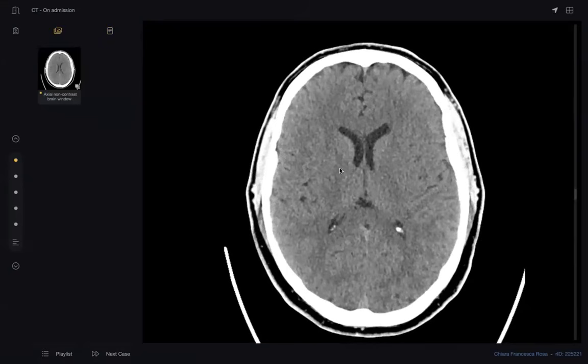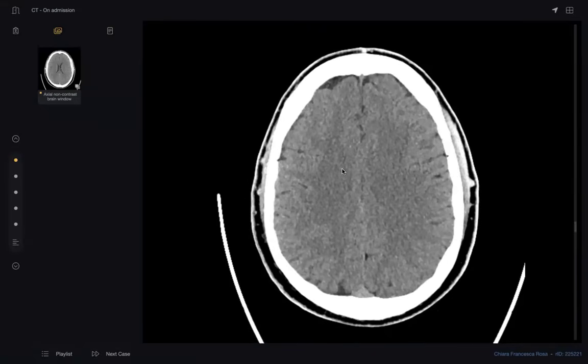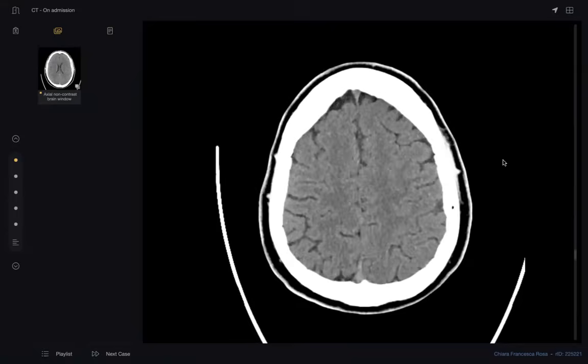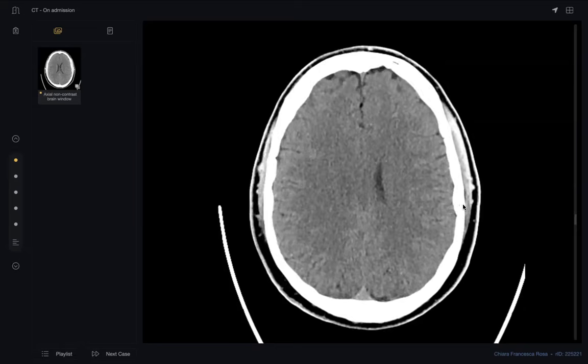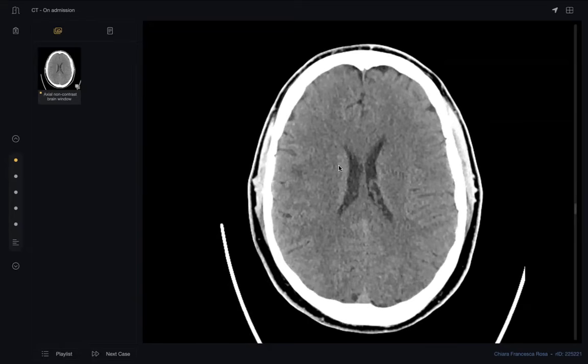As I advise you many times, when you are presented with a modality, and sure, it must contain abnormality, and you expect you can't find anything, use the comparison technique. Slice by slice, compare this side with this side. Okay? Compare here with here. Go down. If you compare this side with this side, there is at least a discrepancy.